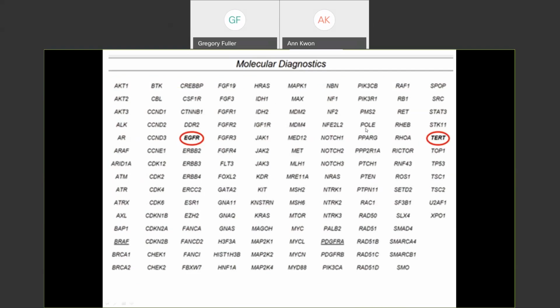It's visual, it's pattern recognition, it's unambiguous to the primary care physician. You don't have to hunt down a list to find which one, out of all of the negatives, is positive or lost. It's screaming. Now note, what the circles say is these genes are altered. It doesn't mean mutated per se. It could be amplification. It could be insertions, deletions, the indels, etc. You have to look at the second section immediately below this to see the details.